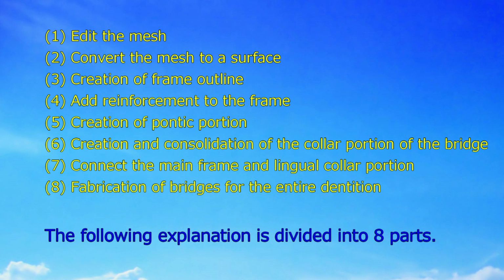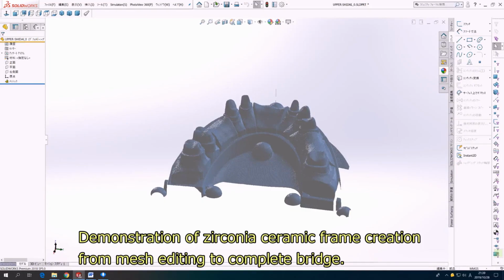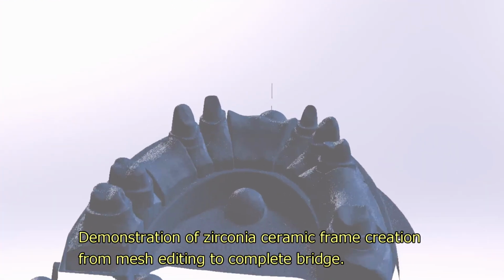The following explanation is divided into 8 parts. This example will be illustrated using SolidWorks. 1. Edit the mesh. Demonstration of zirconia ceramic frame creation from mesh editing to complete bridge.